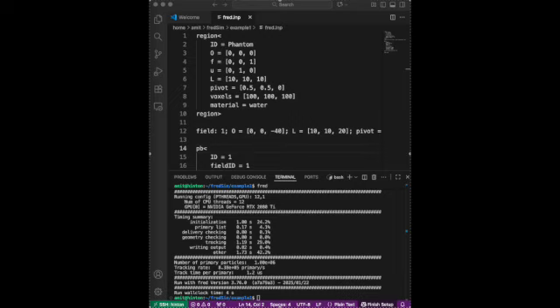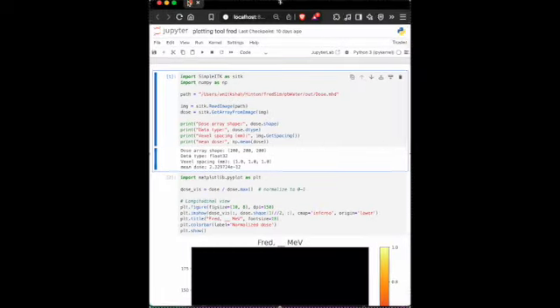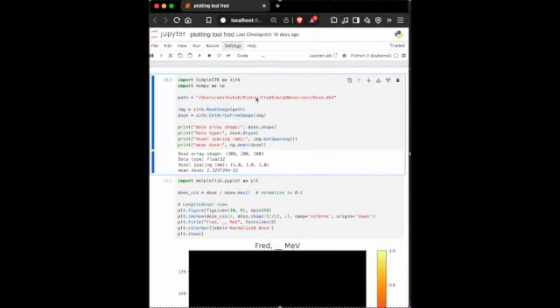I'll just show you what the output looks like, and I hope it works. So every time I run any FRED code, it goes here and saves it in this file, and they never change the name. It's always dose.mhd. I'm just going to run it.